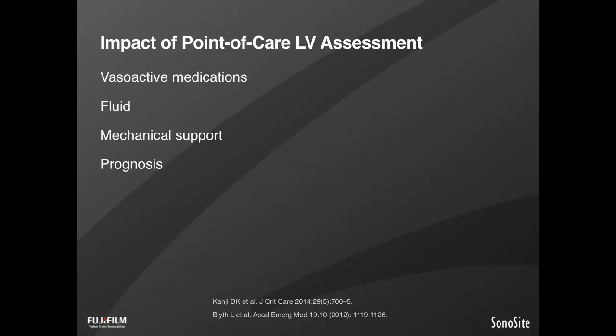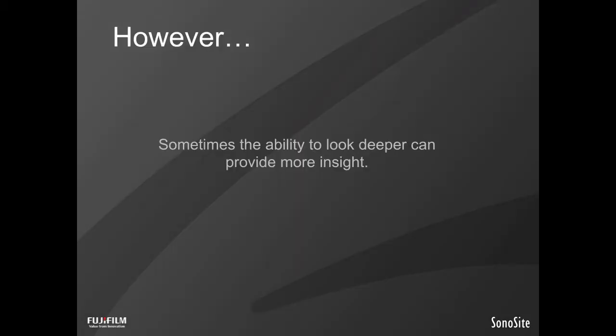And assessing the LV with the eyeball approach has tremendous implications, as I've mentioned already, for our patients, and the choice of vasoactive medications, volume administration, mechanical support, and prognostic information as well. So the eyeball method for LV function, it works for me 9.5 times out of 10. And it drastically influences patient care on a regular basis for me, including just taking LV considerations off the table, which is as important sometimes as finding a smoking gun in that left ventricle, as many of you have heard from me in the past.